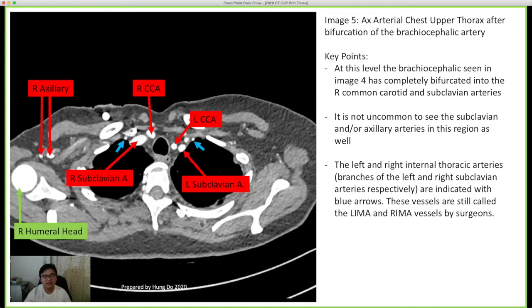This is the left subclavian artery and the left common carotid artery as well. The right common carotid artery and the right subclavian artery. Remember that your carotid arteries come from a common space, and that these eventually will head up the neck and into the respective areas in the face and in the front of the brain. Remember, your vertebral arteries are what supply the posterior aspect of your circle of Willis. Your axillary vessels are seen here.